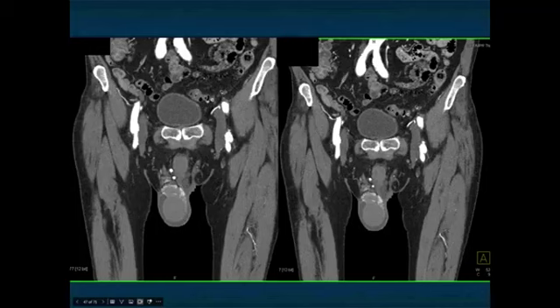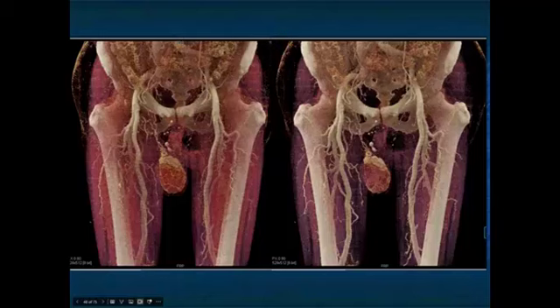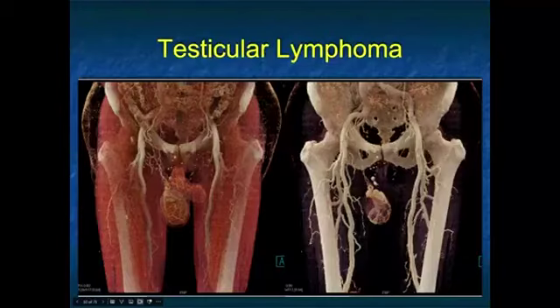So you've got to be thinking that we're talking about a testicular tumor, seminoma, germ cell tumor, but you also can have lymphoma, beautifully visualized on this patient's cinematic rendering. This was primary testicular lymphoma, a really nice case. Another patient.